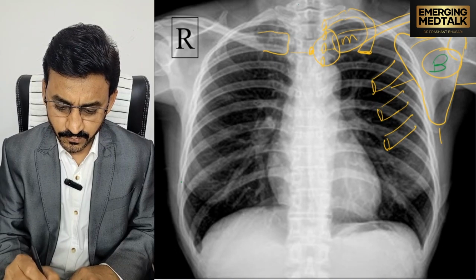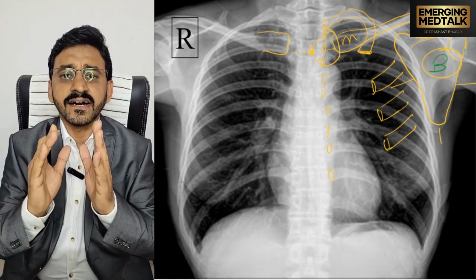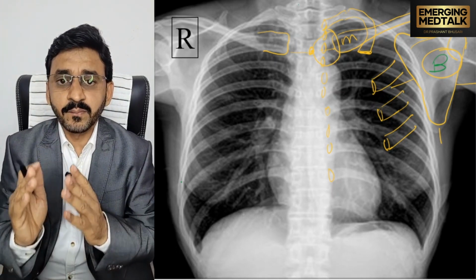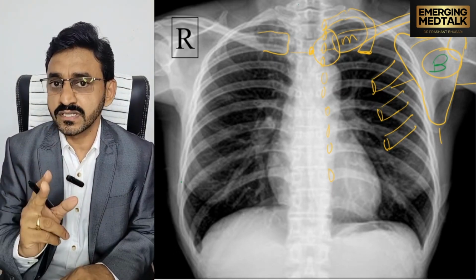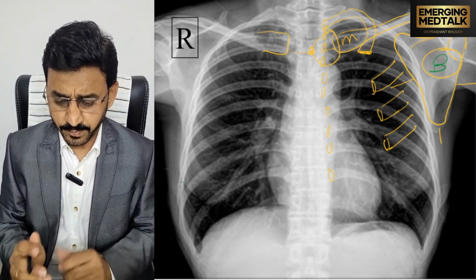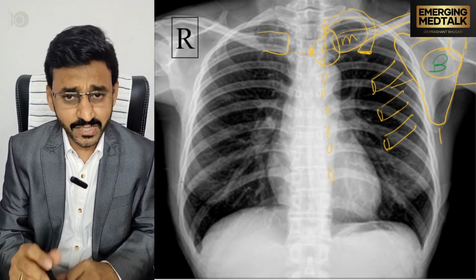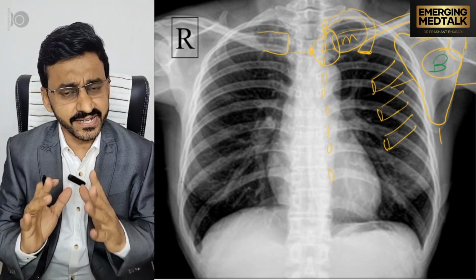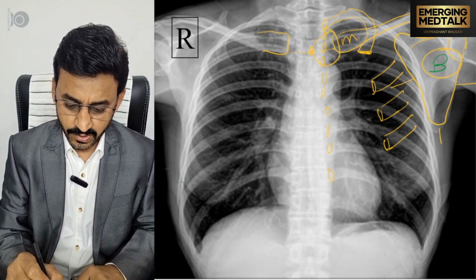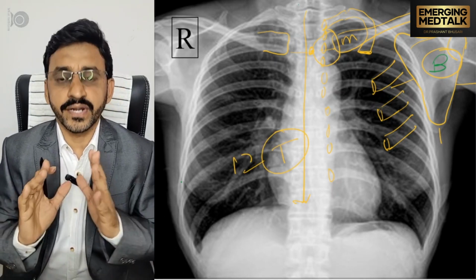Here will be the fourth, fifth, sixth, seventh, eighth, ninth, tenth. These are the posterior ends of the ribs. The anterior ends look interrupted because they articulate with the sternum through costal cartilage, and costal cartilage is not seen clearly on the X-ray. This is a big difference. We will also see the thoracic vertebra: the upper four very clearly, and the lower ones barely visible. In all there are 12 thoracic vertebra.